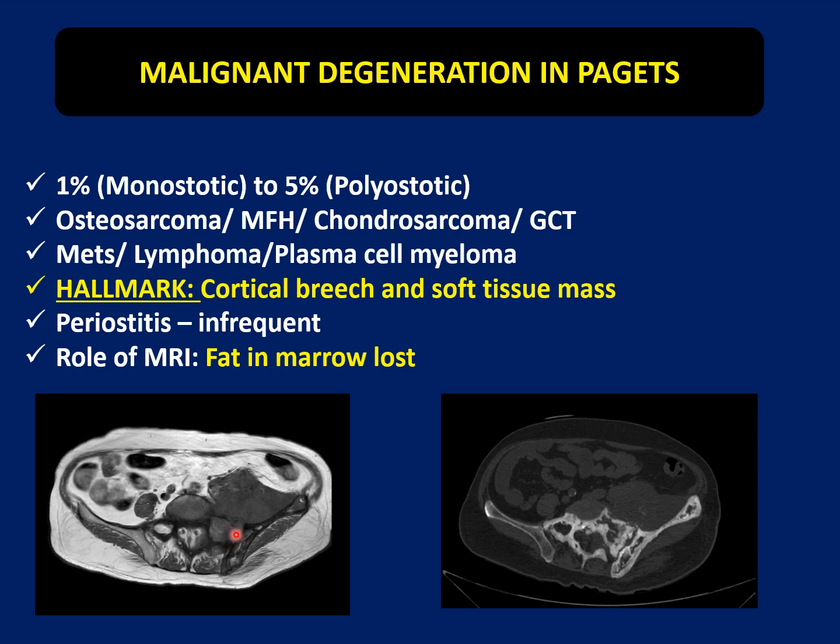The bone marrow in Paget's is predominantly fatty. Sometimes it can be T1 hypointense when it is in the lytic stage or when there is granulation tissue, but that would be a patchy or speckled appearance. It won't be a diffuse infiltrative appearance as seen in this particular patient. So here MRI scores over CT in identifying whether there is infiltration of the bone marrow.